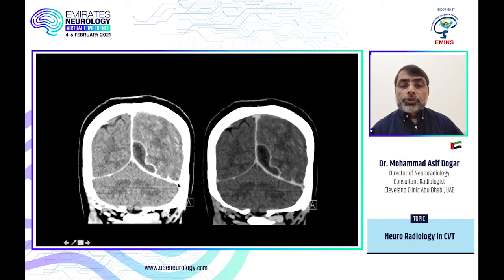If I look here, I don't see anything, but again, I have to change the window. If we change the window, now you can see there is a filling defect in the left transverse sinus, superior sagittal sinus, and the right transverse sinus is okay. So what is the lesson from this case? If you have mastoiditis, make sure you look carefully at the transverse sinus, change your window, and document the patency of the transverse sinus.